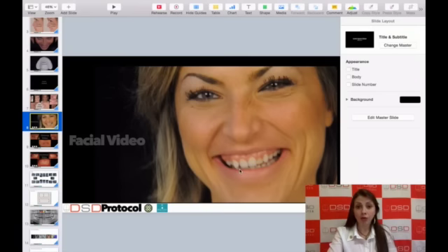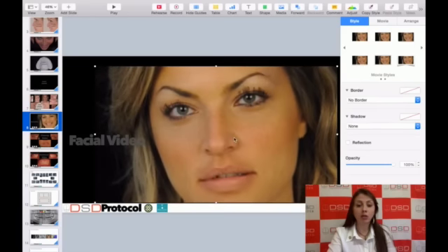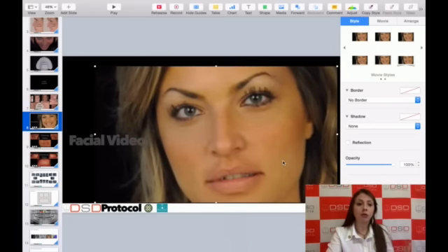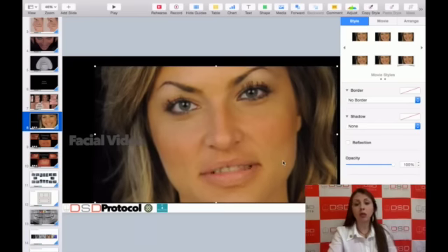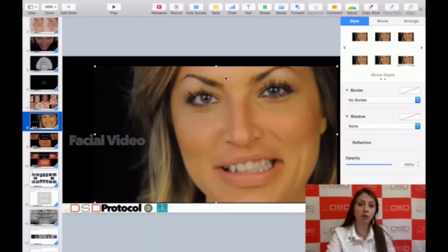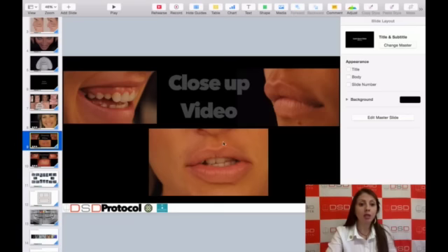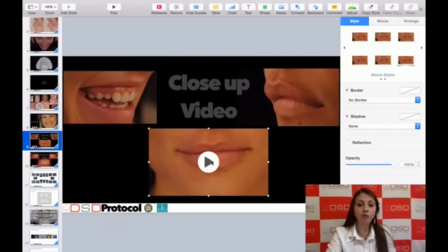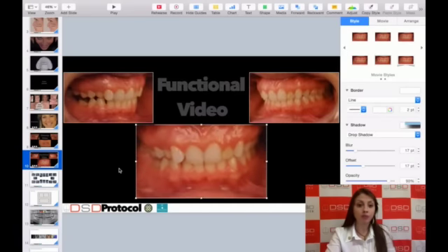Then we go through a facial video to find out what the patient wants. You can ask a few questions for the patient and see what the patient would like from the smile and all that, but all these questions you also learn when you take the DSD course. Then you go to the close-up video, where you also have a few things you ask the patient to say, and finally the functional video.